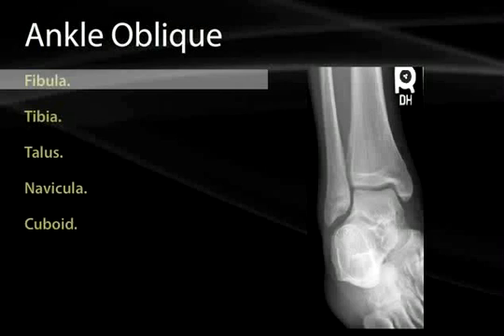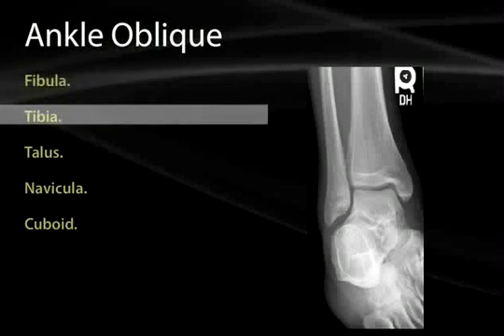So the fracture of that fibula tends to be through the eversion of the ankle itself, where the bones will come in proximity to one another and it will snap the fibula somewhere a little further high on the leg. On the tibia, very broad bone, again looking for osteosarcomas in the central medullary portions of that bone, looking for avulsions off of the bottom edges of that medial malleolus, and for any pits or cracks coming up along the base of the tibia where it articulates with the body of the talus.